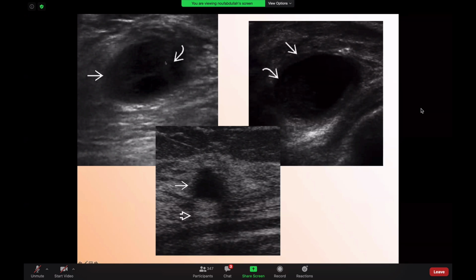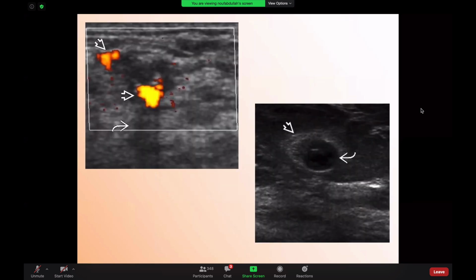Yeah, I agree. The same thing here. If you think that the wall within the cyst is thickened, you think that it is too much for you, then I would advise for biopsy. Yes, no problem. You should biopsy this lesion. But this is just an example of an inflamed cyst. This is just another example. When you see here, you can see that there is vascularity. This should be biopsied. This one, if you think there is no vascularity, you still can follow it up.